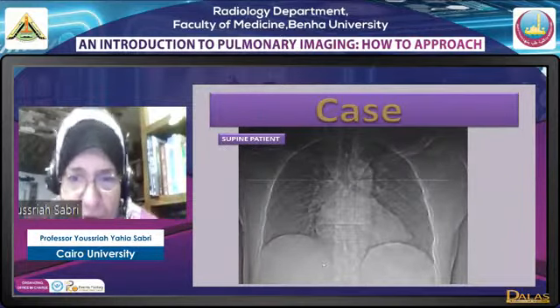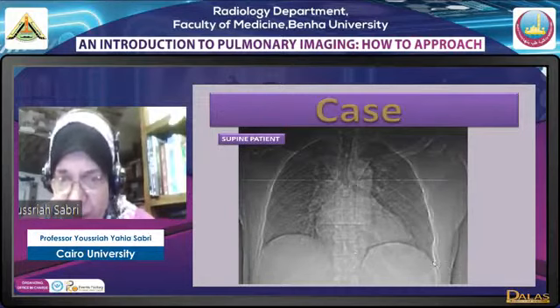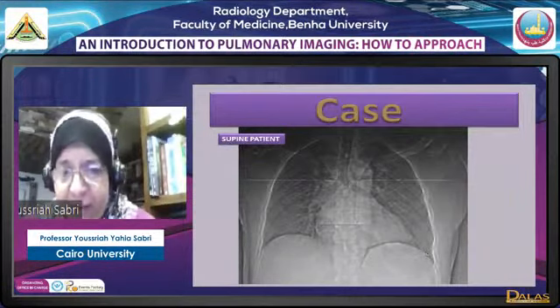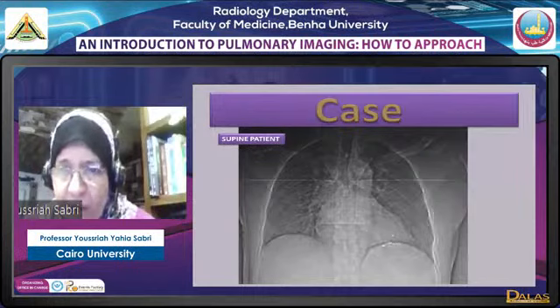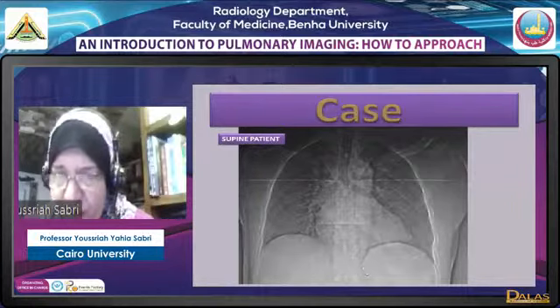Another supine patient, and here the lesion is, this is the normal. This is the deep sulcus sign, and it's even on both medial and lateral aspects. And this is the clear diaphragm sign. But mark it, take care here, because you will have the same impression on the other side. You may have an impression that you have a clear diaphragm sign, so don't depend much on this sign. The most important sign to diagnose pneumothorax in a supine patient is the deep sulcus sign.